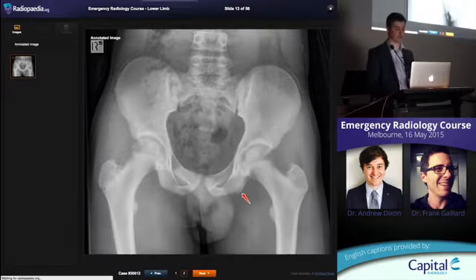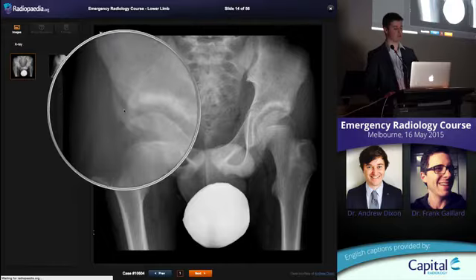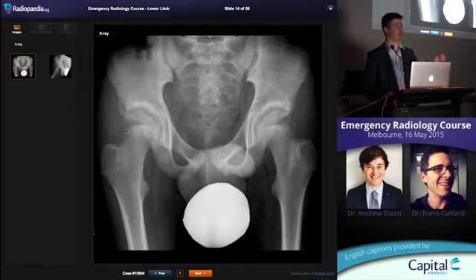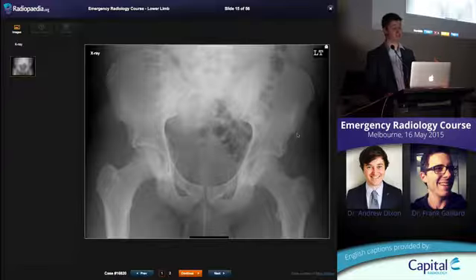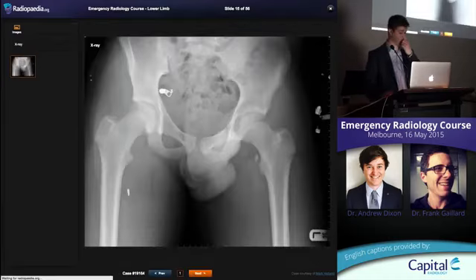I'm going to take you on a little tour of all of them here. Here you go, little separation of bone just above the acetabulum, that's the rectus femoris origin, or AIIS, avulsion. Here's another one on the other side. This is above the AIIS. This is the ASIS, sartorius, tensor fascia lata, bone pulled off. Here's the lesser trochanter pulled off by iliopsoas.